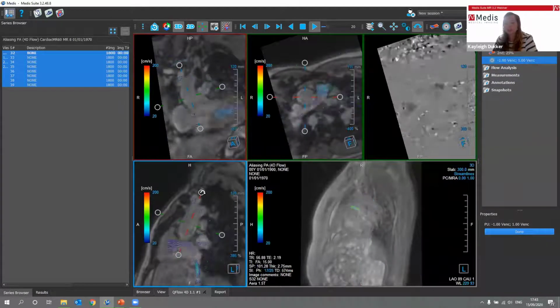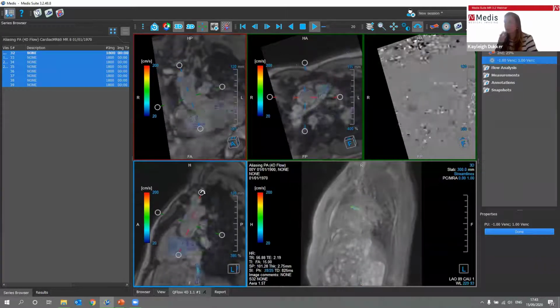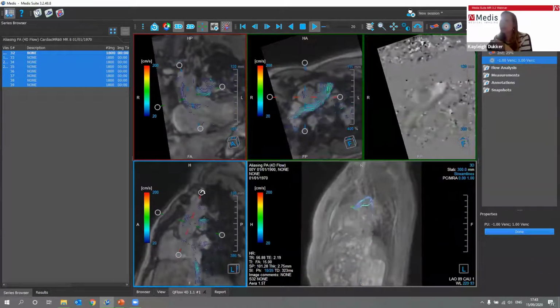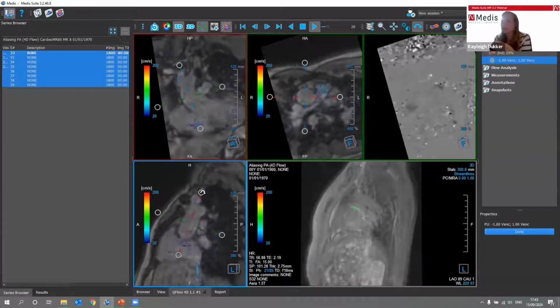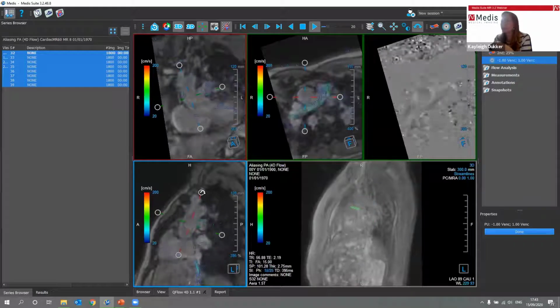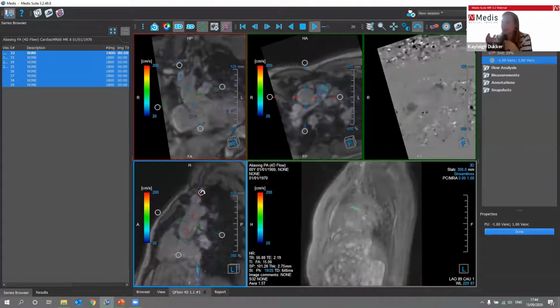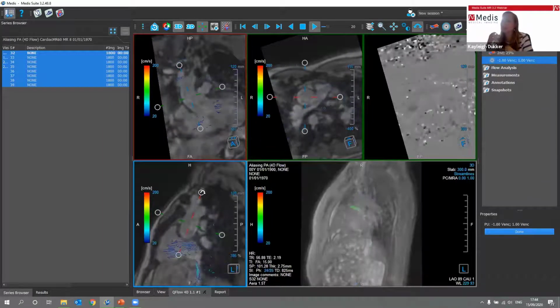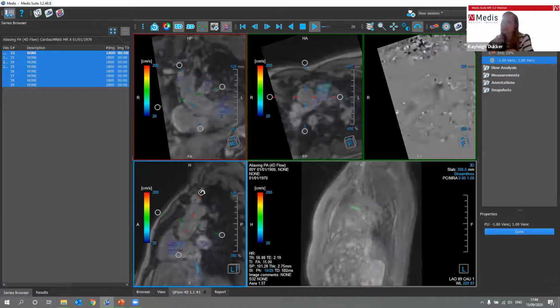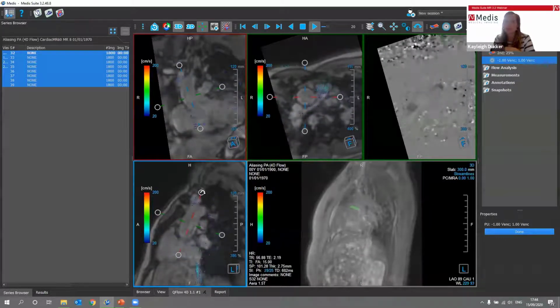However, it's still important that you try to scan on the right venc, especially if there is aliasing. Then similar to with 2D flow phase unwrapping, you will basically miss then if the venc should actually be higher, then you miss a bit of the lower venc or lower velocity information when you do apply the phase unwrap.